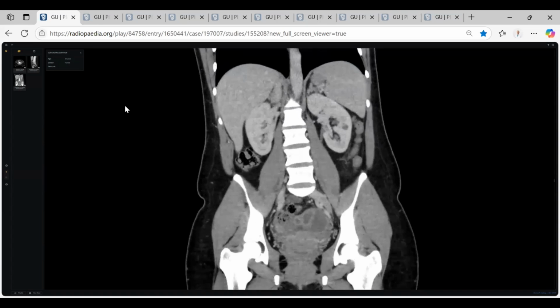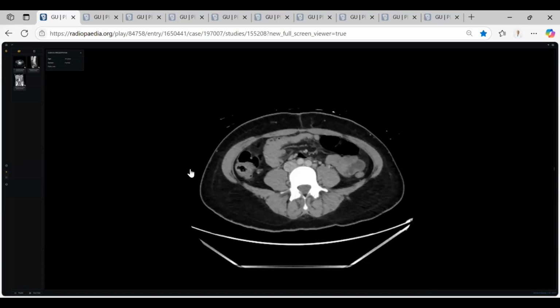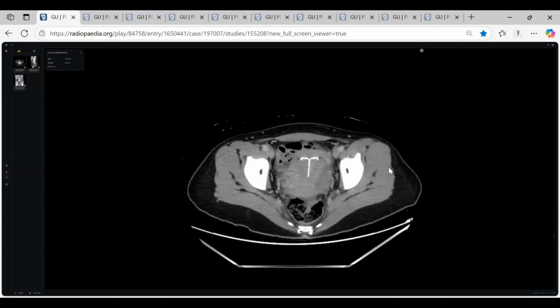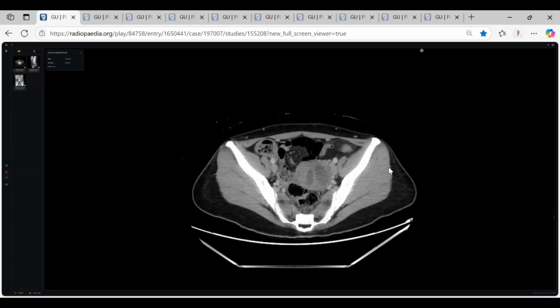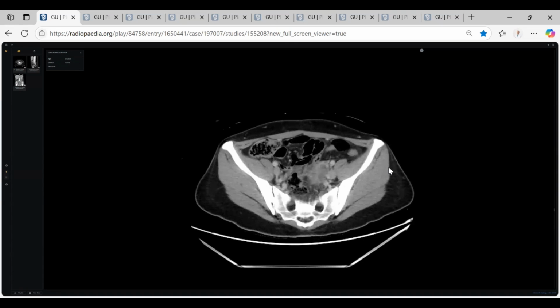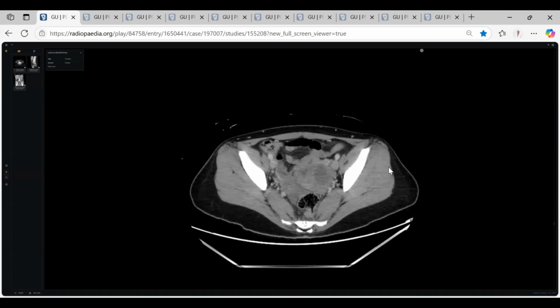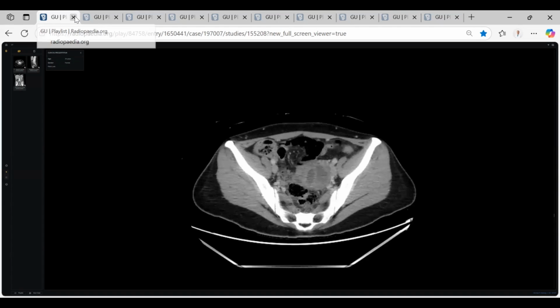This is a tubo-ovarian abscess, or even surgically, if they discover this is a pyosalpinx, it is the same surgical approach, because these cystic structures are convoluted and interconnected, with a little bit of connection. And it is bilateral, mainly left-sided. Thank you, doctor.